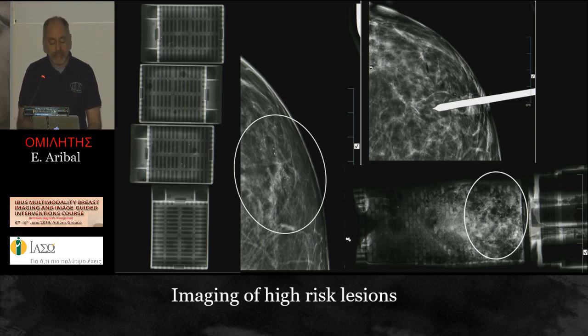But if they don't see it, ask them to look at the specimen in the pathological trays and have the mammogram of it. Here you see the calcifications were on this third one, so I asked them to review this one, and they found the calcifications.